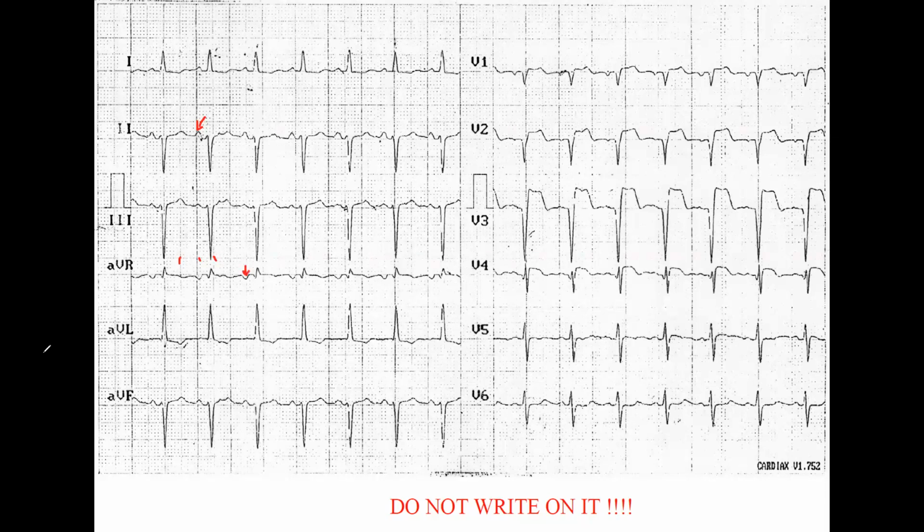P is also positive in lead number 2 and in AVF, and AVR is negative, so we have a sinus origin. The morphology of the P wave is okay.